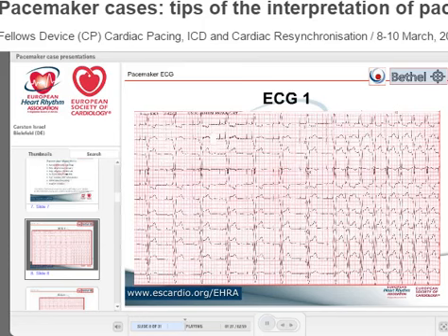So, okay, wow. This is the third example you see in this course. It is maybe not very representative, but it's good because the more you repeat it, the better you know it. And I love this ECG because it is the best I've ever seen for retrograde P waves. You see them here, right? The retrograde P wave should be looked at in lead II, ideally, and it's very clearly visible. So it's like a WPW: ventricular excitation, retrograde conduction through the AV node, and antegrade through the pacemaker-like accessory pathway. Okay?